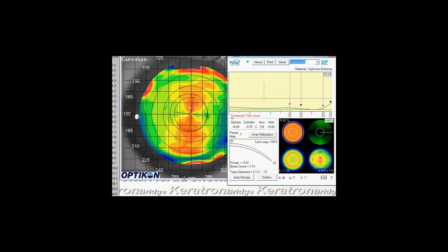So before we move on to step number 3, which is optic zone placement, I've opened up the software here, and now we'll just enter in the values. This is the default design as it opened up. So we're just going to enter in the diameter, because that was step 1, 10.8, and then we're going to enter in the design mode, which is RSIM, GSIM, or freeform. And looking at the cornea, we decided on GSIM, so I'll just select GSIM. And that's all there is to that.